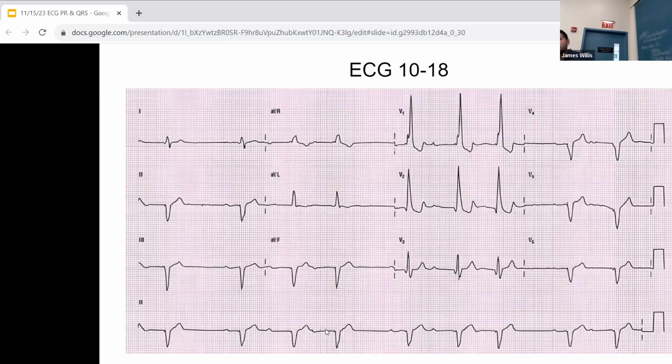Actually, I think it's buried in the T wave, but it's not even dropped here. So maybe there's another P wave inside the T wave here, and then it drops. So this is secondary. What about these QRS complexes here? Is this WPW as well? No, I don't think so.